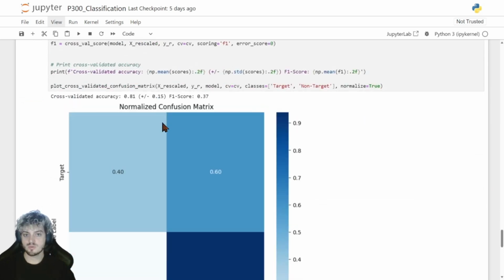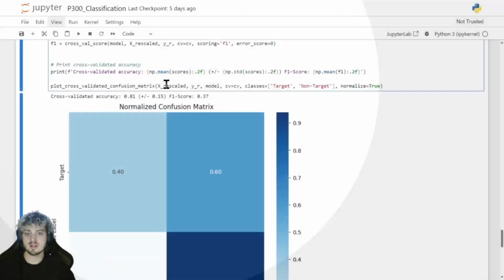Okay, in the cross-validation, we also get another important information. We have increased the variance. So this is actually not good news, because an increased variance creates instability. So if you imagine to move this classifier into a real-time application, a high variance is what causes the application to prompt wrong output more often, right?